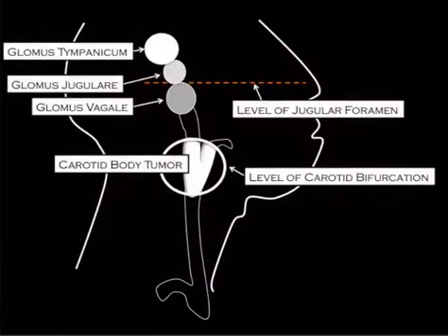So this is a glomus tumor, paraganglioma, and there is a whole bunch of different vocabulary for these things, which could lend itself to extreme trickery. My interactions with academic neuroradiologists is that they get really annoyed if you don't describe it as the exact one. So I would not be surprised if the distractors are all glomus tumors, so you have to be able to tell them which one is which. That sounds scary, but it's not that hard. I'm going to help you out.